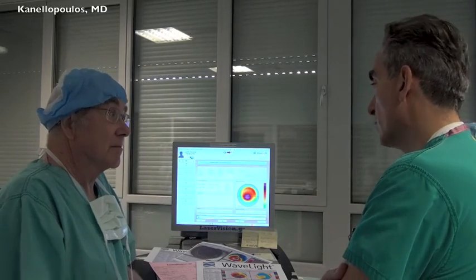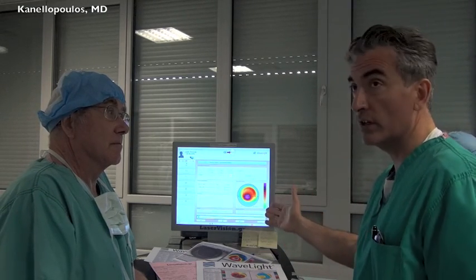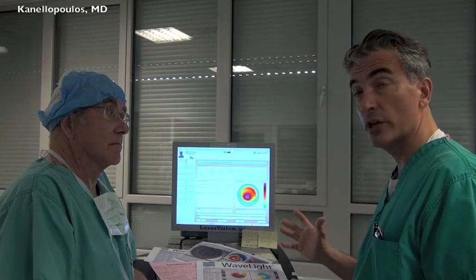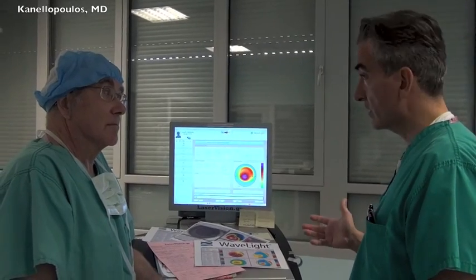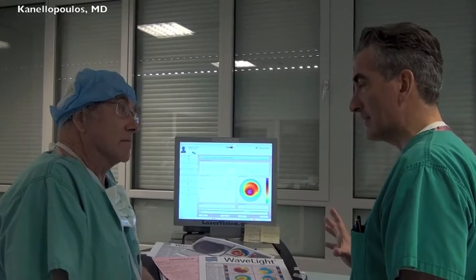Right. We have had, though, and we've reported on this, we have had to treat corneas that were as thin as 350 to begin with. And on those corneas, we trimmed them down to maybe 330, the only other alternative being a penetrating graft. And we have done this in the past, we've reported this, and we got away with it. But we don't practice this routinely.